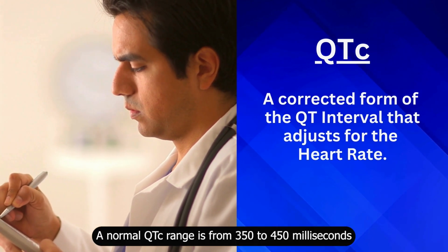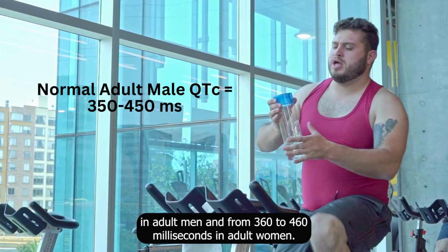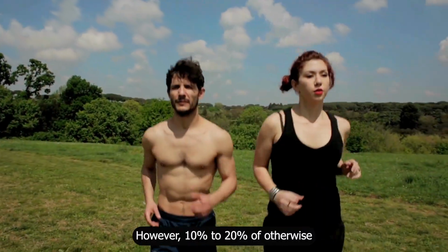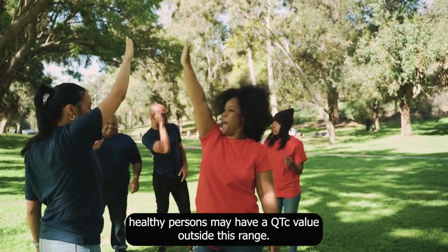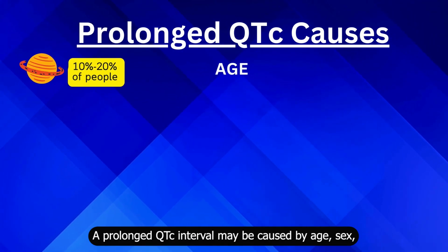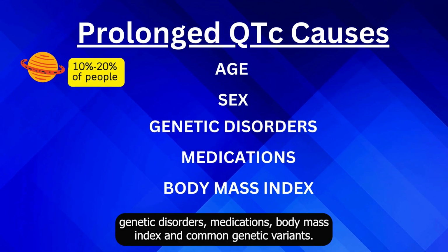A normal QTc range is from 350 to 450 milliseconds in adult men, and from 360 to 460 milliseconds in adult women. However, 10% to 20% of otherwise healthy persons may have a QTc value outside this range. A prolonged QTc interval may be caused by age, sex, genetic disorders, medications, body mass index, and common genetic variants.